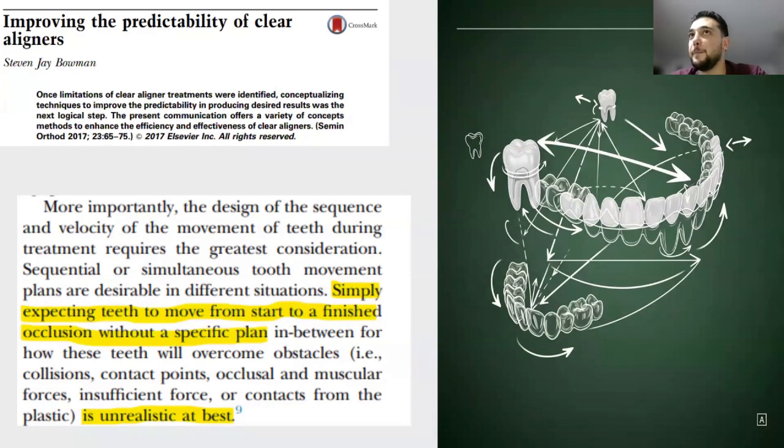Sometimes we get a lot of doctors that apply what I call cartoon orthodontics. So they basically just move the teeth on the simulation until they get to an ideal alignment or a beautiful final setup. But this will only look good on the viewer. This might not always translate clinically. So in order to understand how these movements are going to translate clinically, we need to go by our checklists, the way that we can go over a treatment setup, stage it properly, and make sure everything goes according to plan.